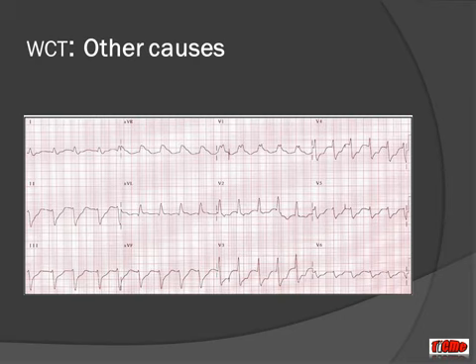Sodium channel blockers cause widening of the QRS, and one of the diagnostic features, particularly one that predicts for becoming unwell, is a dominant R wave in aVR. That's a good little trick. Usually there's an S wave in aVR. Once you start getting an R wave that is a greater height than the S wave in aVR, you should be concerned in the context of a sodium channel blocking overdose. Now this is all R wave and no S wave, and a very broad QRS complex. Some of the other features of sodium channel blockade that are concerning are a QRS width greater than 160.